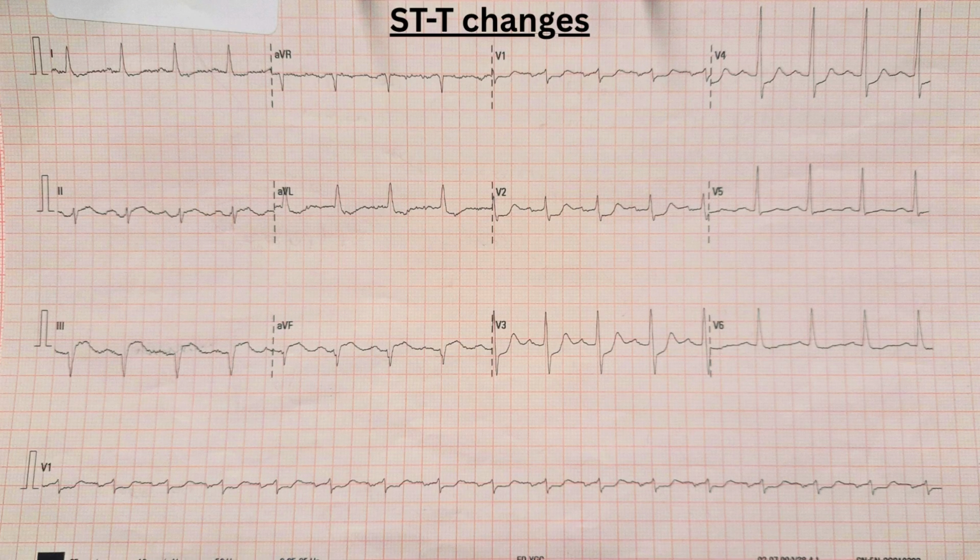But wait, there is more. Did you catch the reciprocal ST depression in lead 1 and aVL? These reciprocal changes strongly support our diagnosis.